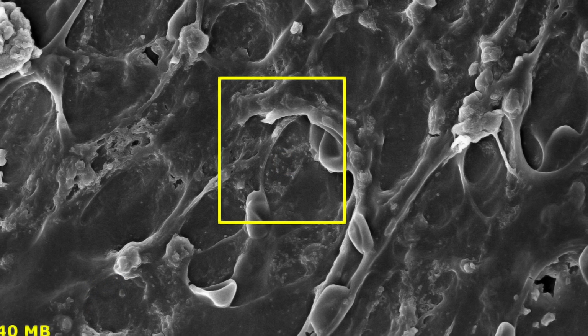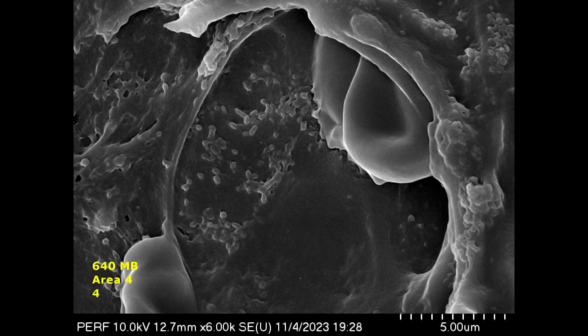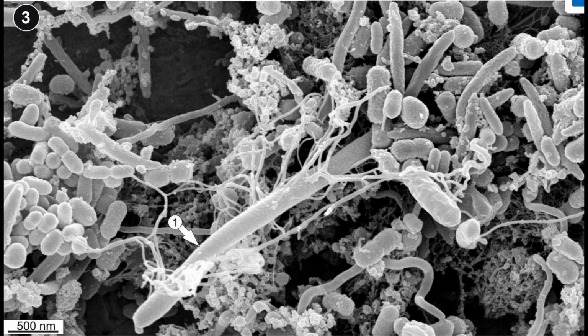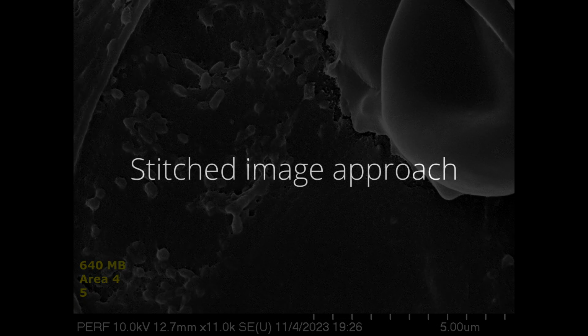morphology. And when you look closely, even at the soft tissue, it looks like you have an area where there are morphotypes, but these are not bacterial morphotypes. This is how demineralization occurs. If you look at Christoph's pictures from a size point of view, you can see that sometimes these bacteria can be just 100 nanometers wide. So those decalcification spicules are on the small side, I agree, but you have to be careful.